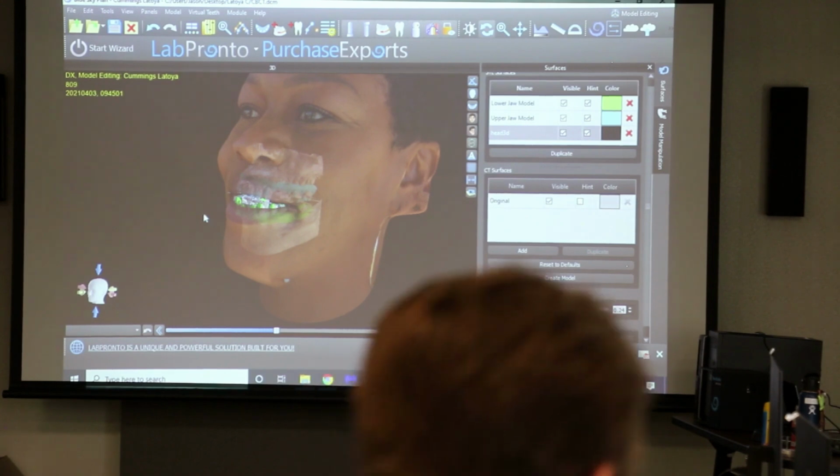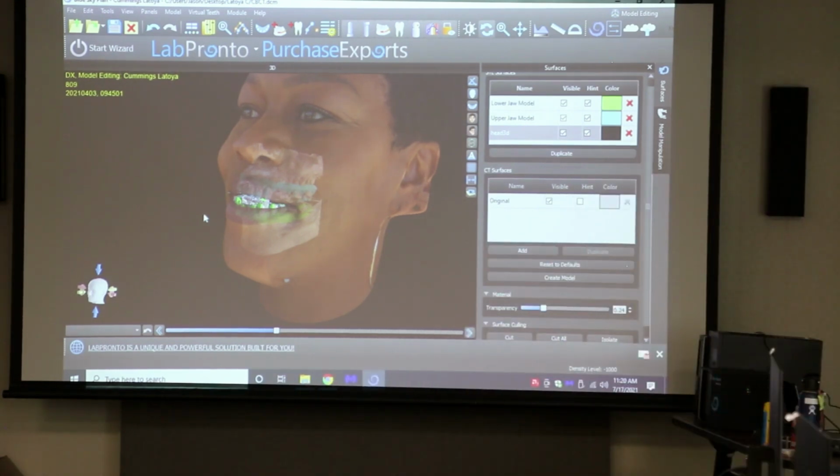Manual or automatic. So you want to manipulate the lower jaw, because we're trying to just line it up. The lower jaw, this is the one that's going to move. And now we want to associate that with the upper jaw.